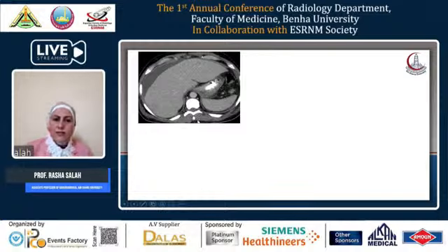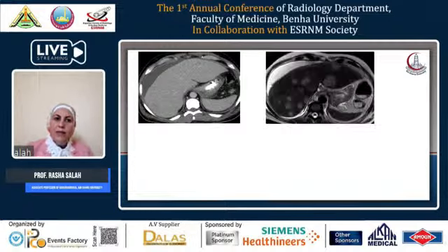This patient presented to our department with abdominal pain and ascites, and ultrasound detected a small focal lesion. Here, this is the CT for the patient, and this is the MRI performed 2 days after the CT. Unfortunately, on the CT images, we can't interpret all these focal lesions. The time interval between the two imaging studies was just 2 or 3 days at most.